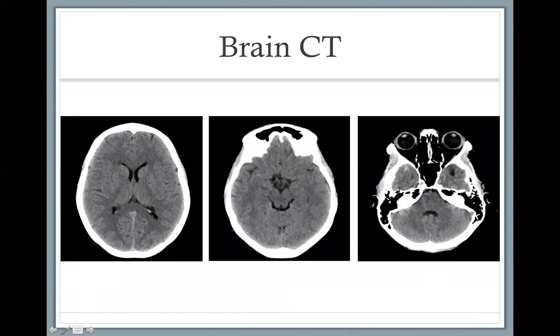Often in a soft tissue window, fluid will appear of low attenuation, almost black. And then you can see there are different areas of low and higher attenuation: the low attenuation in the middle of the brain, and the higher attenuation at the periphery.